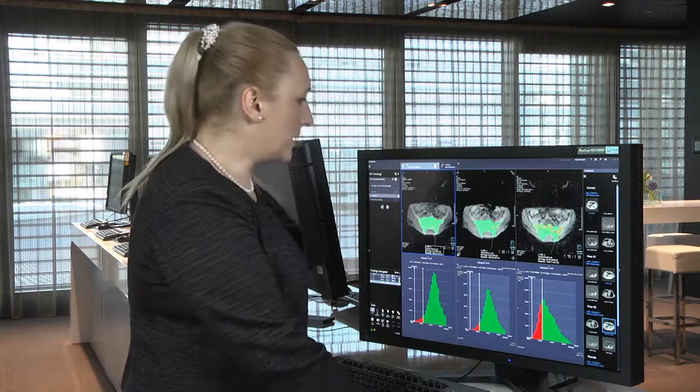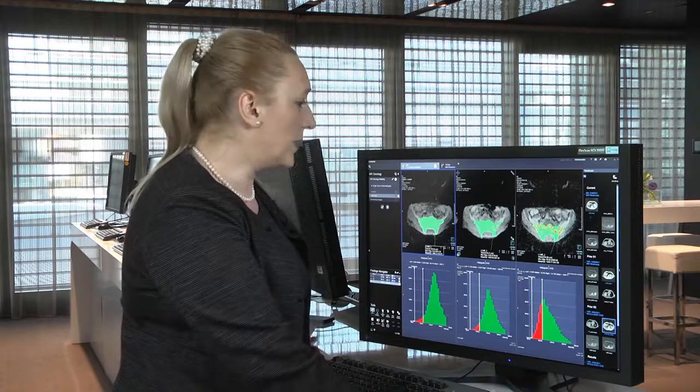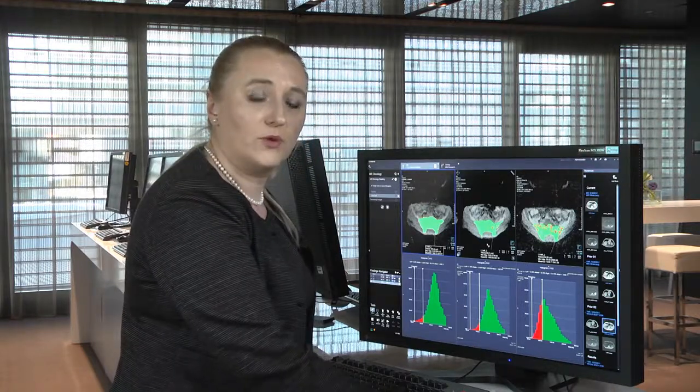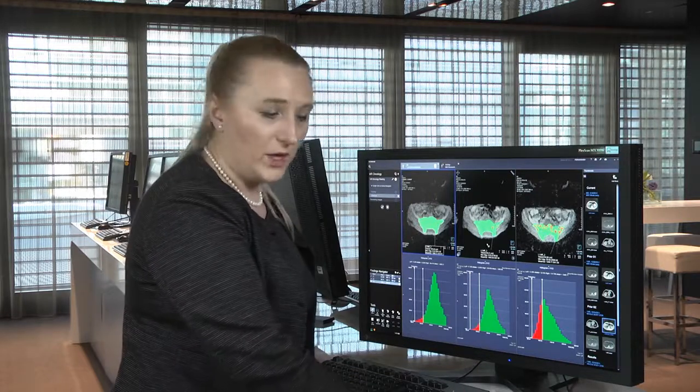What is important is that we can now be a little bit more confident that this patient indeed responds to therapy. And more importantly, you can take a screenshot and send it to your oncologist, perhaps helping them to understand what you are talking about.